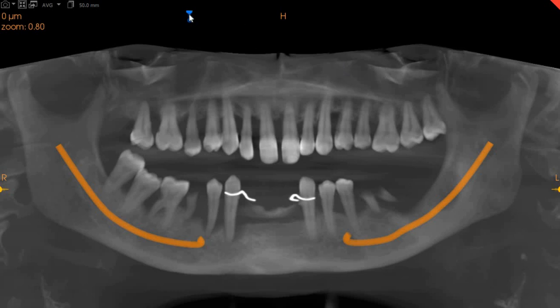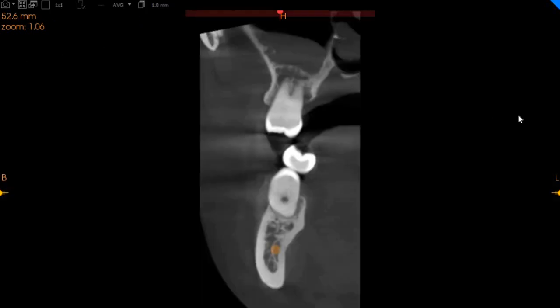Now, we're going to take you through each and every segment from the transaxial point of view. Our initial assessment of the transaxial view is that there is bone loss significant enough around every single tooth that implant placement does not seem to be favorable in such a patient. Now, this is the transaxial view of the upper right 7.